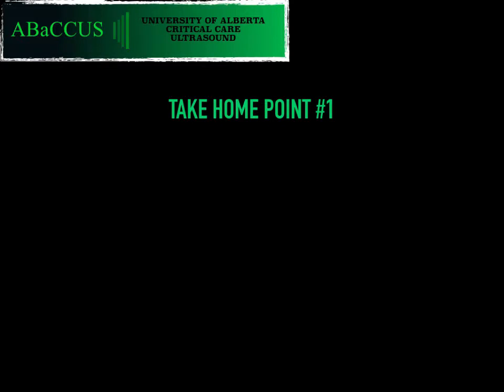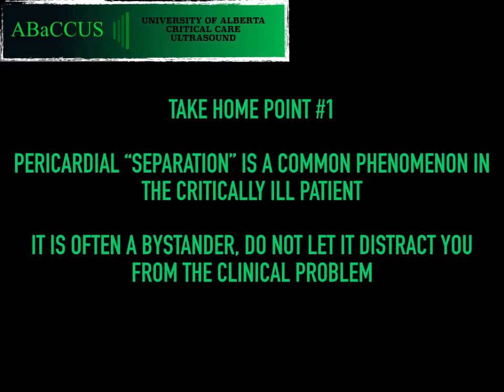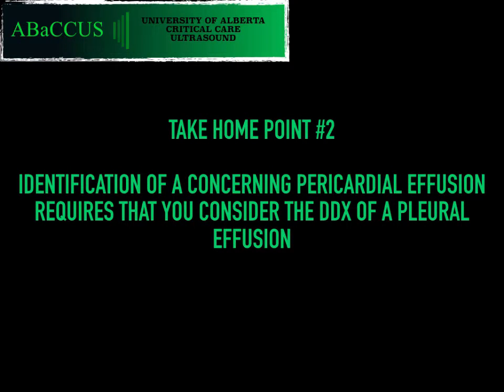So take home point number 1. Pericardial separation is a common phenomenon in a critically ill patient. It's often an innocent bystander and not to distract you from the main clinical problem. Take home point number 2. Identification of a concerning pericardial effusion requires that you consider the diagnosis of a pleural effusion.